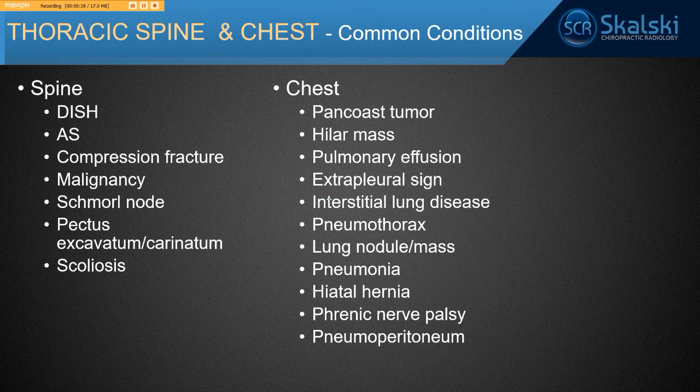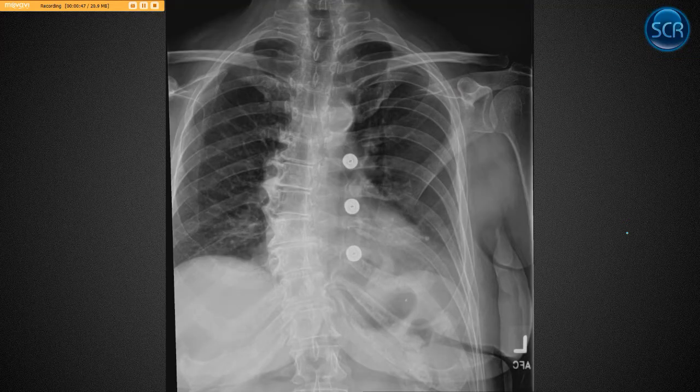All right, so here's some of the more common spine and chest cases you might encounter. So you can review this slide if you want to know a list of cases to go look up. And just to show you a few cases here of the things I mentioned in the previous slide. This case is of DISH, of course.